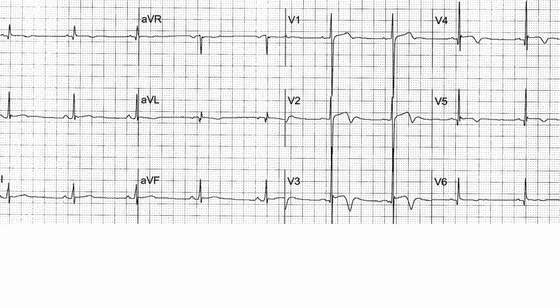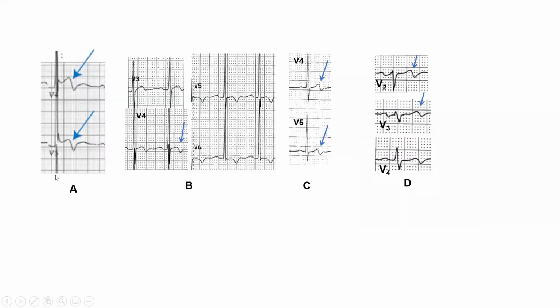This is a young asymptomatic patient, incidental EKG. And importantly, they tend to have pronounced ST elevation, early repolarization, ST elevation before the deep T inversion. Also, they tend to have a very pronounced QRS, as in early repolarization. Early repolarization is often in young people associated with very prominent QRS. So this is not Wellens.